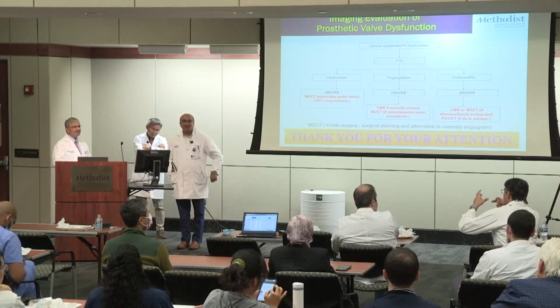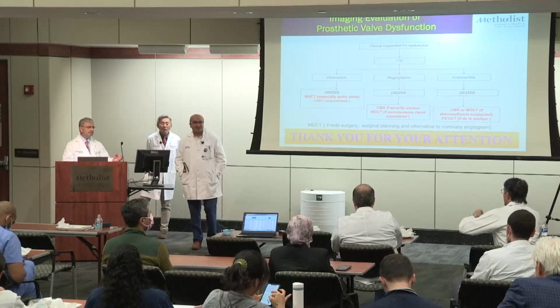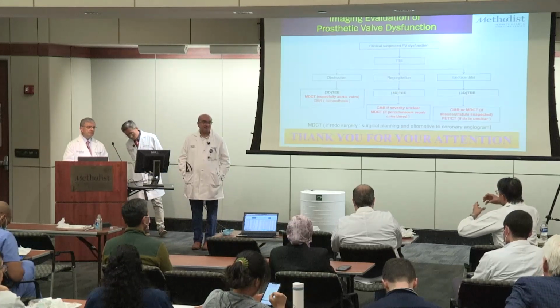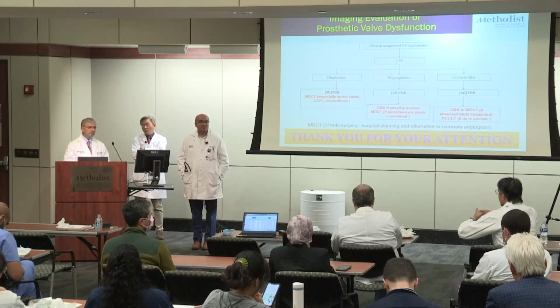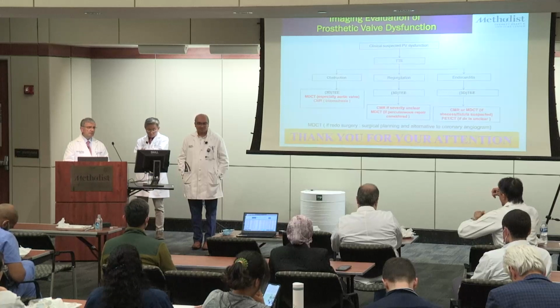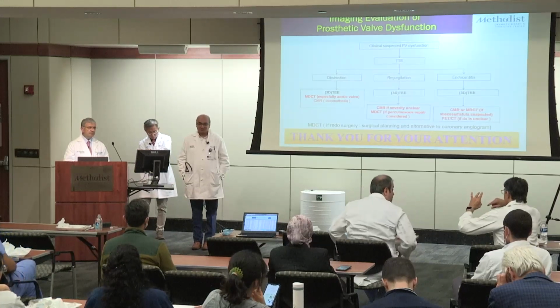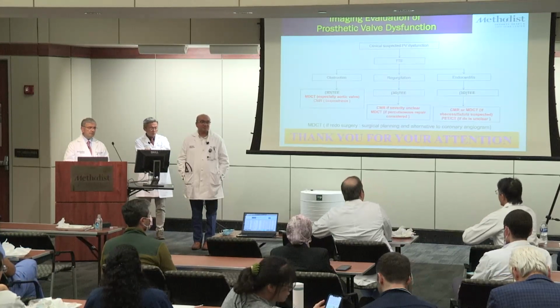I was going to ask you, for these TAVR valves, when you're looking at AI assessment with echo, you often see flow, but as Sumit showed you with CT, these valves often encompass quite a bit of distance from the LVOT all the way up to the ascending aorta. I find it challenging when you look at it in a 2D short axis view of the valve with echo, whether the flow you're seeing really made it to the LVOT.